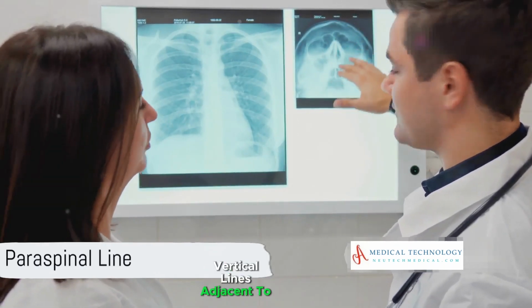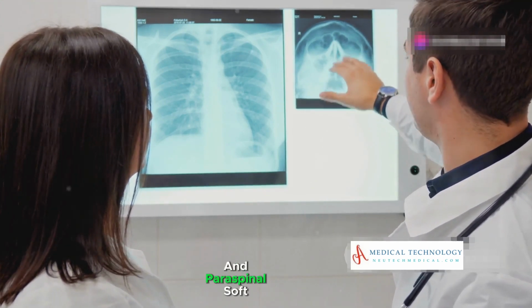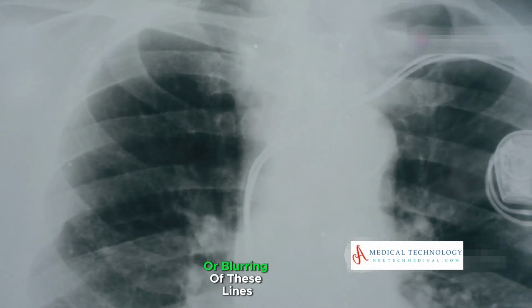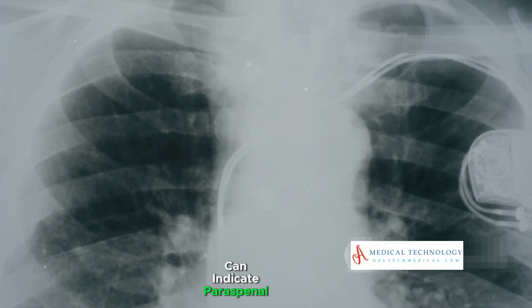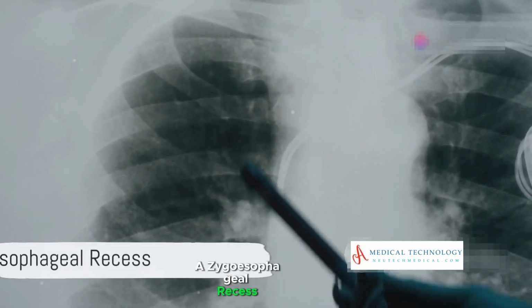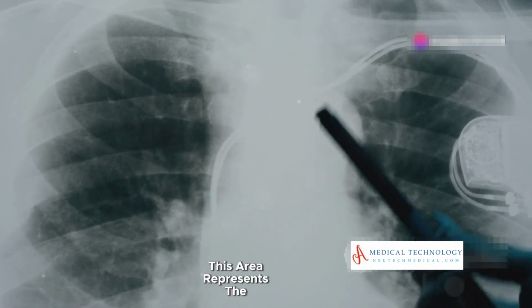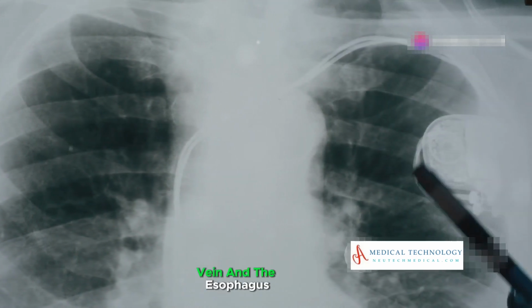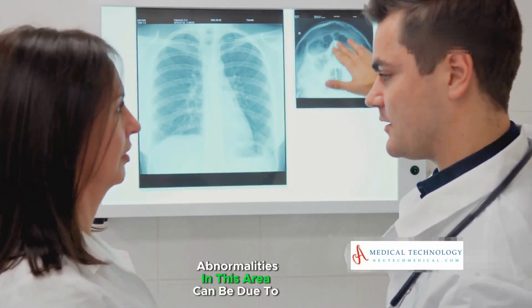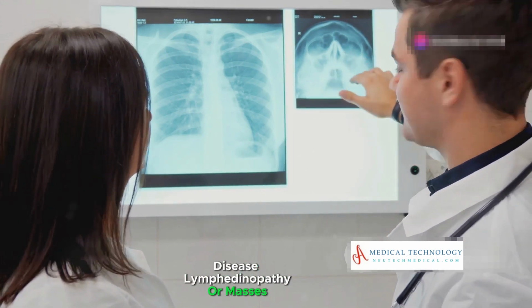Vertical lines adjacent to the thoracic spine, representing the interface between the lung and paraspinal soft tissues. Significance: displacement or blurring of these lines can indicate paraspinal masses, infections, or vertebral fractures. Azygoesophageal recess: located just to the right of the midline, this area represents the interface between the azygos vein and the esophagus. Significance: abnormalities in this area can be due to esophageal disease, lymphadenopathy, or masses.